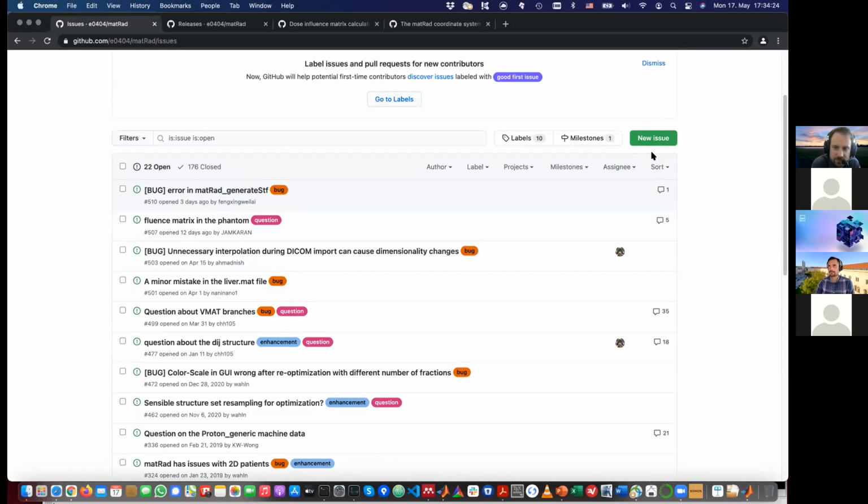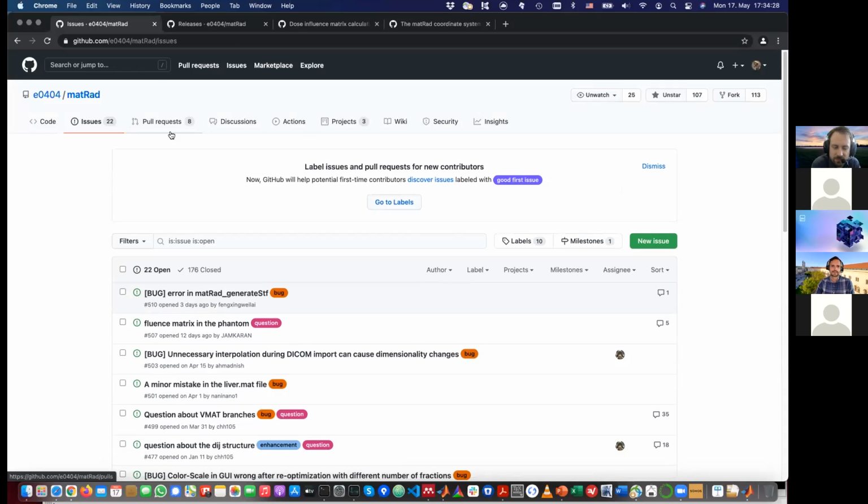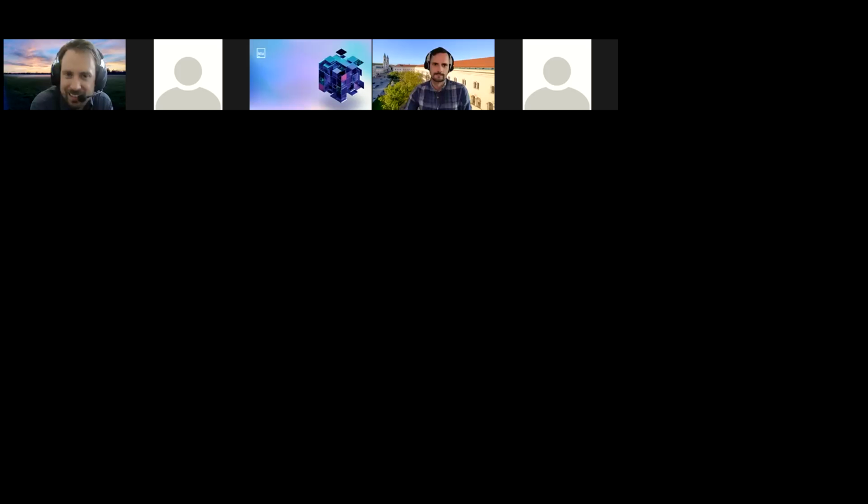But yeah, if you encounter an error, then the best place always is to go to our GitHub page here under issues and report your new issues, and then basically you start a discussion with us and all other people. For the tutorial, of course, it will probably not make so much sense to start 50 issues on GitHub. So for the next days, you basically have us and you have the Google Docs.